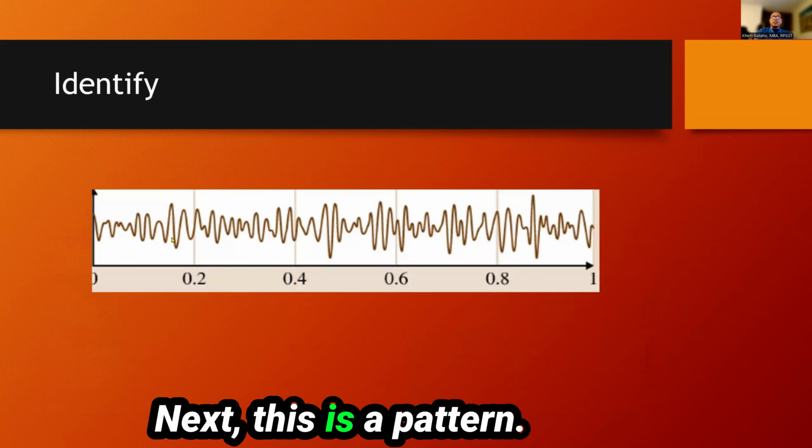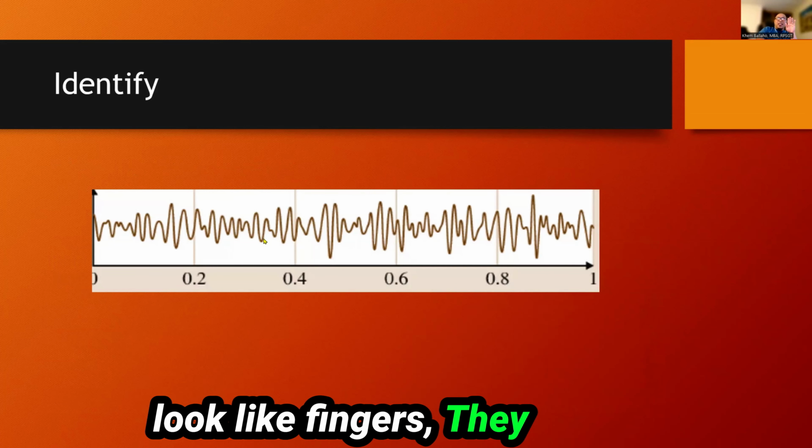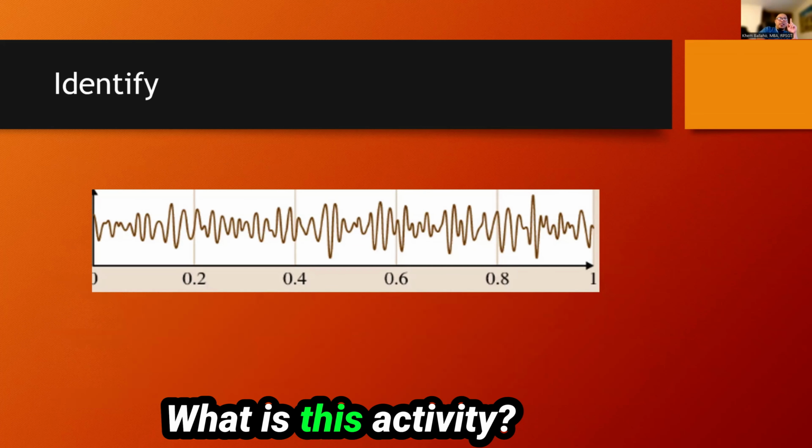Next, this is a pattern. I made it big, but they look like fingers. They look like little fingers. What is this activity?